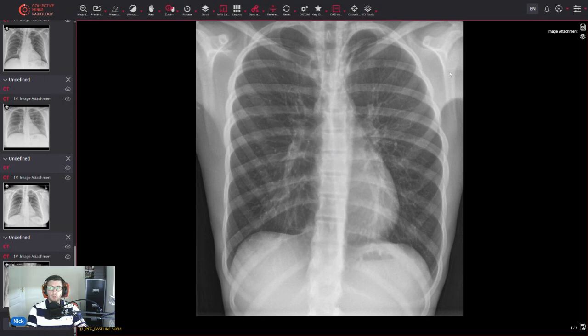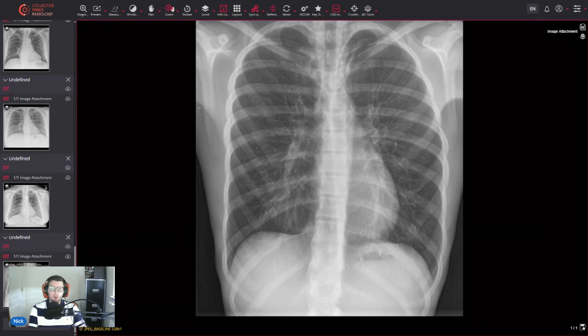There is something called pectus carinatum, which is pigeon chest, or it looks essentially a bit more barrel-like. So it's the opposite, basically, where the anterior chest curves outwards. Not as large volume lungs. Obviously, better to assess these on the lateral projections rather than AP or PA.